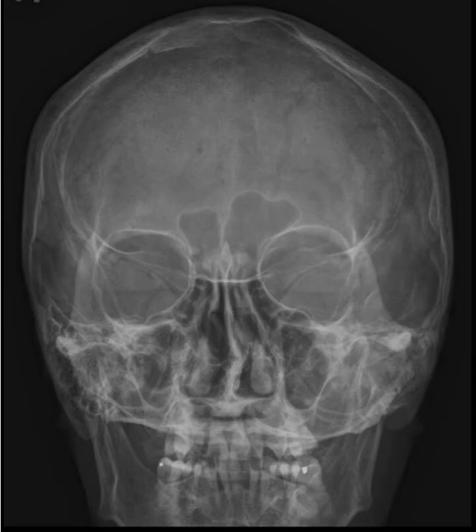Hello, this video is for radiologic technology students to learn the radiographic criteria of a PA Caldwell Skull X-ray and how to assess the PA Caldwell Skull X-ray for diagnostic quality. So the first thing we want to do is make sure that we didn't clip any anatomy at the top and the bottom or side to side.